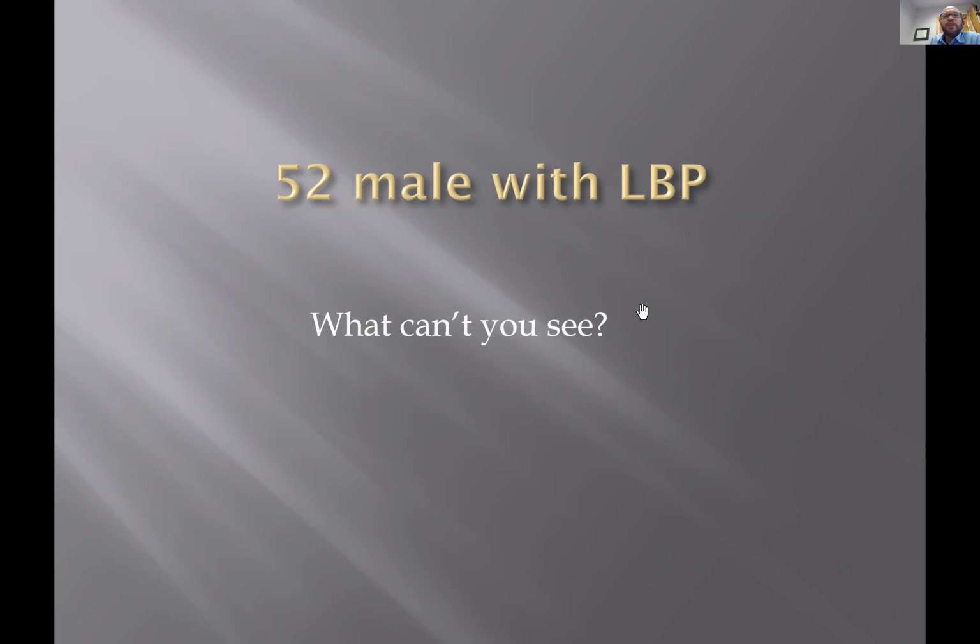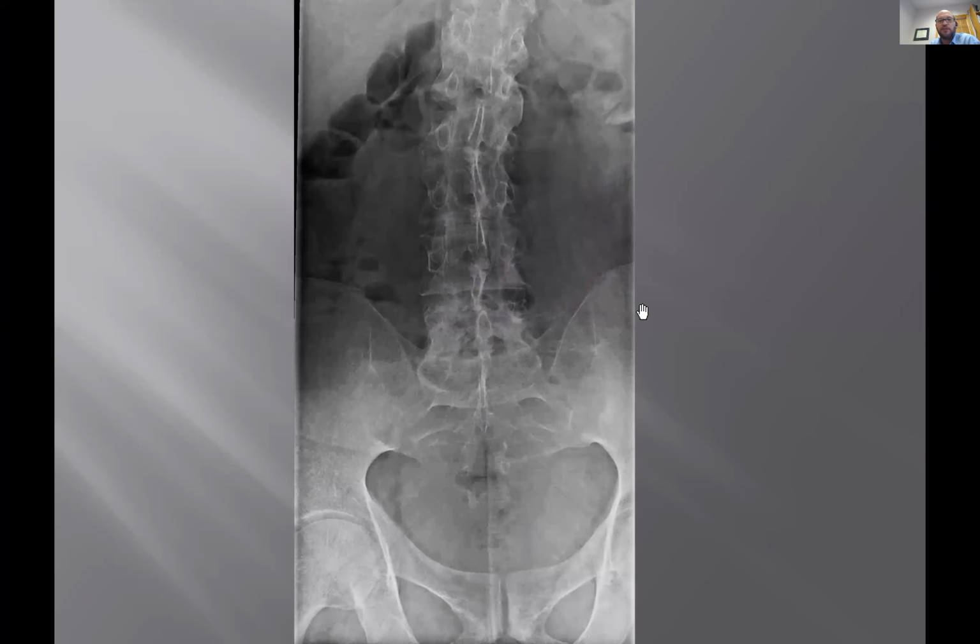52-year-old male with low back pain. And the question is not what can you see, but what can't you see? So again, another detection question, trying to get you involved here. What can't you see? Go for it. Somebody jump in.